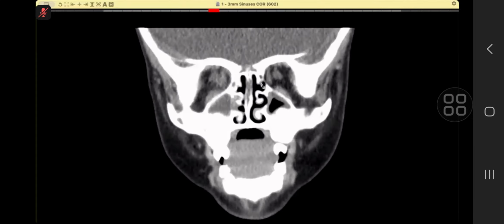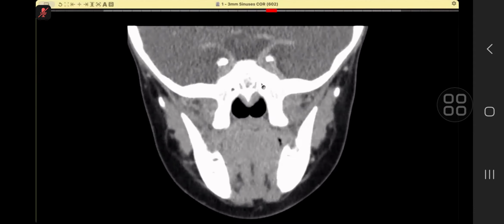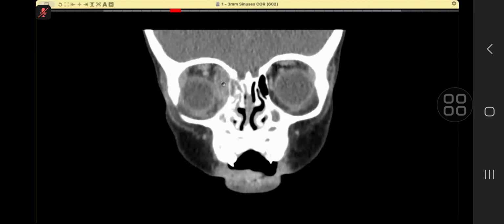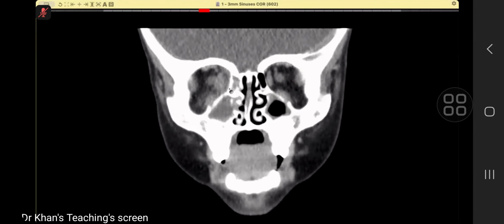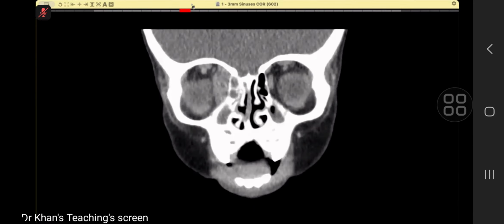In your pertinent negatives, etc., the candidate did very well. We pointed out the cavernous sinus, and the cavernous sinus was normal. But one of the pertinent negatives should be that as we go posteriorly, of course, I did not show coronal, but this is the optic nerve, so you can say that it is abutted, but it is not compressed, or in another case, if it is compressed, call it. So they consider it an absolute emergency. Okay, well done.